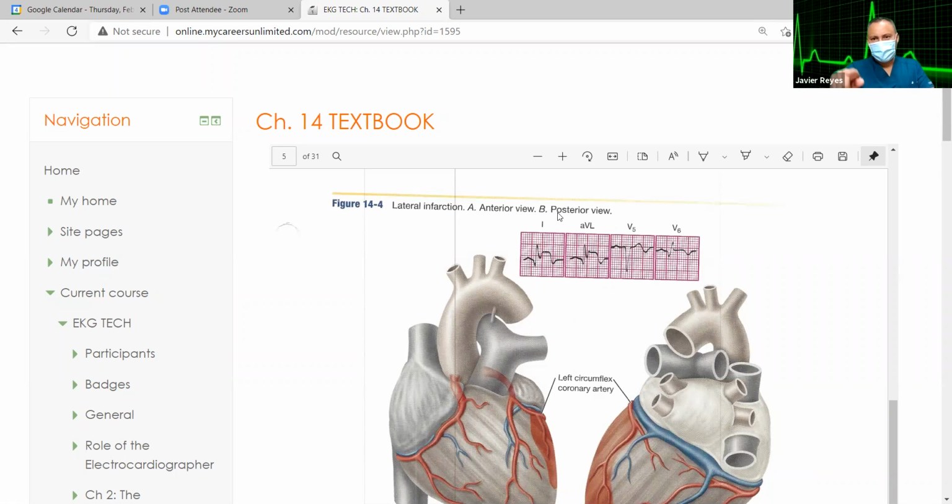And then what follows after that? The T wave. Correct. And on mine, the inferior. You're on which one? AVL. Okay, tell me again what you see, Norma. That the S and the T are. Okay, well, tell me what that's called. It was from yesterday.